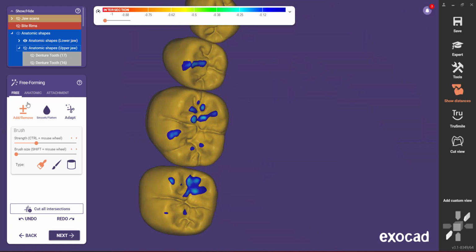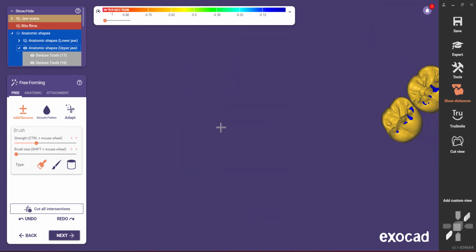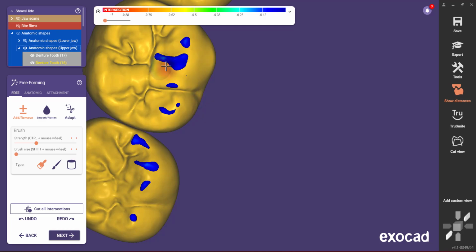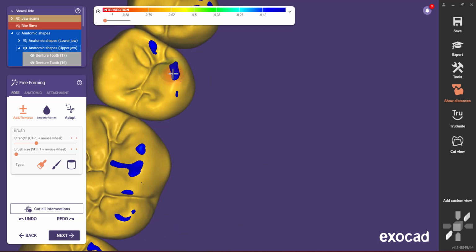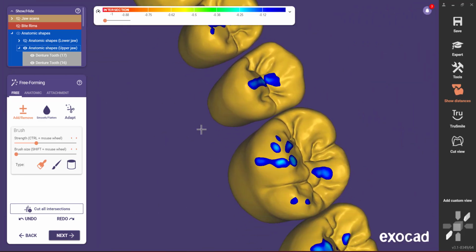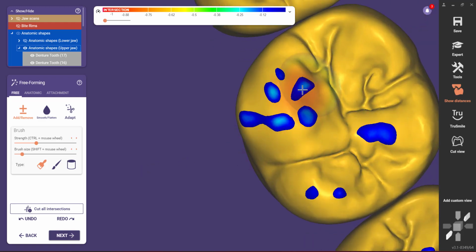All right, we're mostly dark blue. And if you want to, you can split the difference. If you felt like you needed a little bit more, then I would turn it over and make the other portion of my adjustments on the maxillary arch, just to keep things somewhat even. So maybe wherever I see light blue still present, like right here, I'll do that on the maxilla.